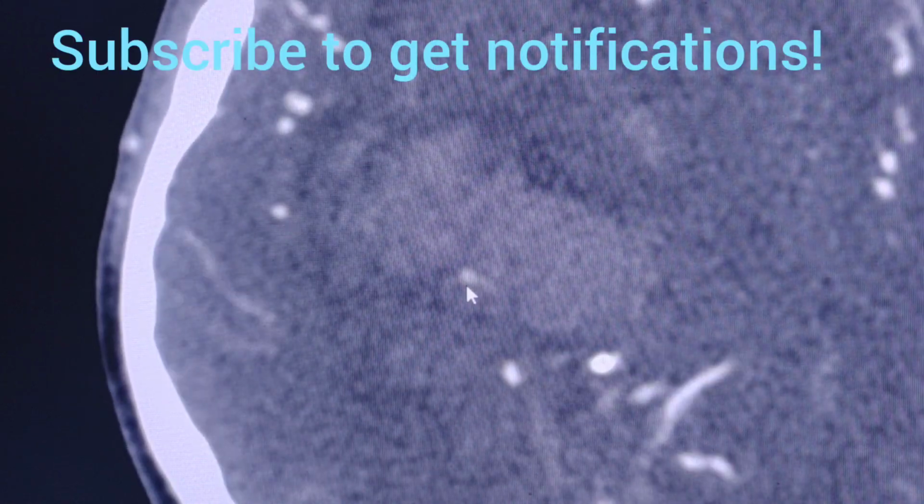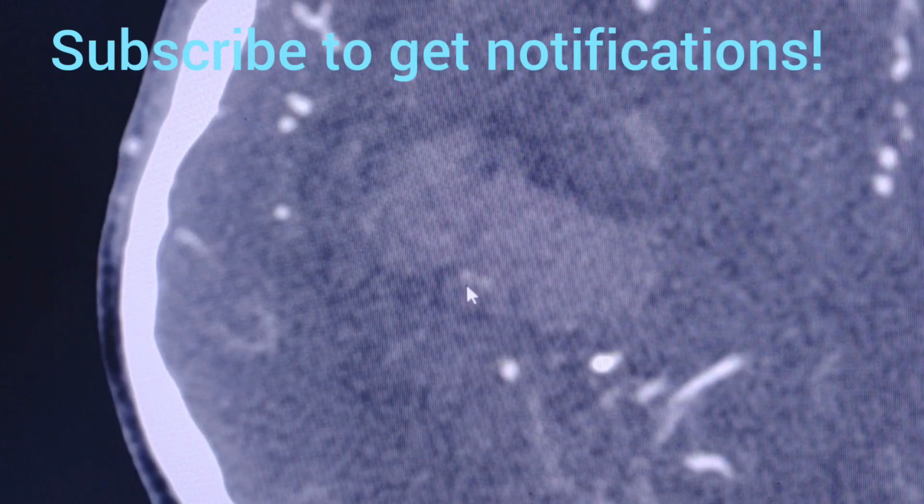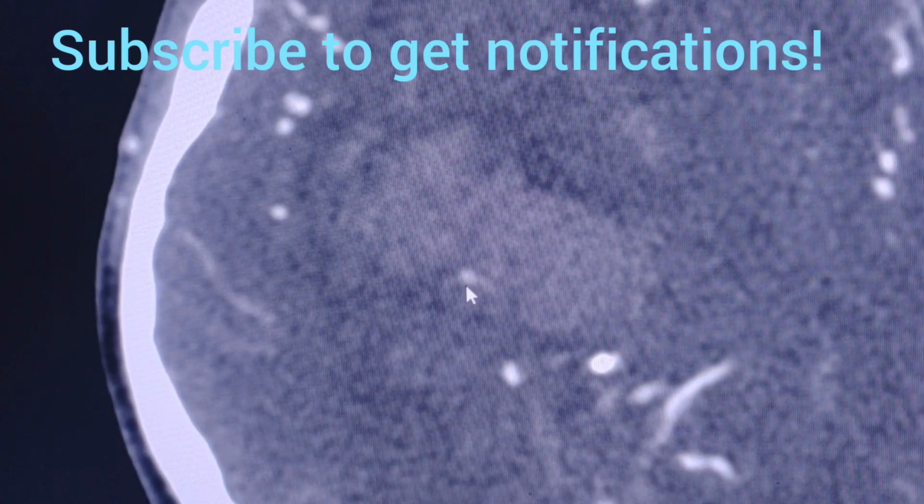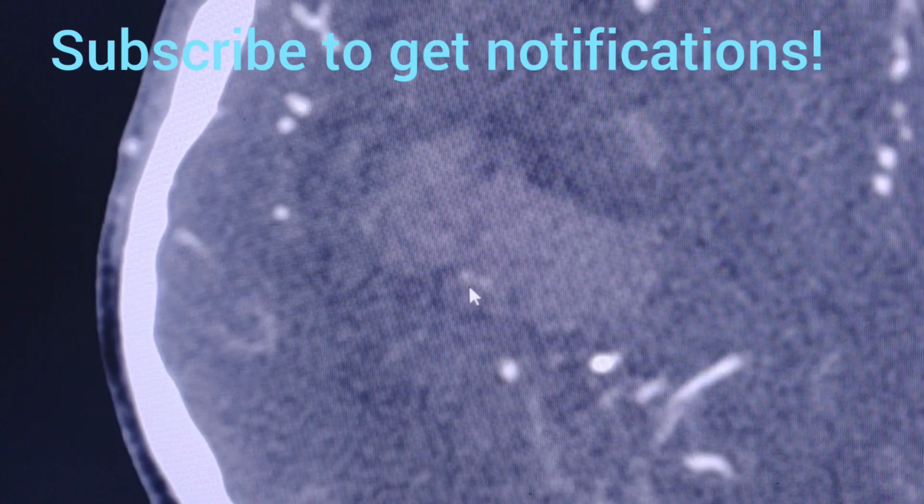Actually, this is the source of the active bleed. And the most possible diagnosis in cases like this is a rupture of microaneurysms of the perforating arteries, the Charcot Bouchard aneurysms.